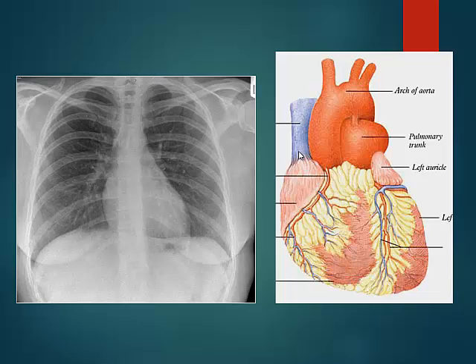But if you have a patient with right heart failure, this can become distended and may become prominent. What other structure is here? Ascending aorta. So you can just see here the ascending aorta. If there is aneurysmal dilatation of the ascending aorta, you can have a prominent bulge in that region.